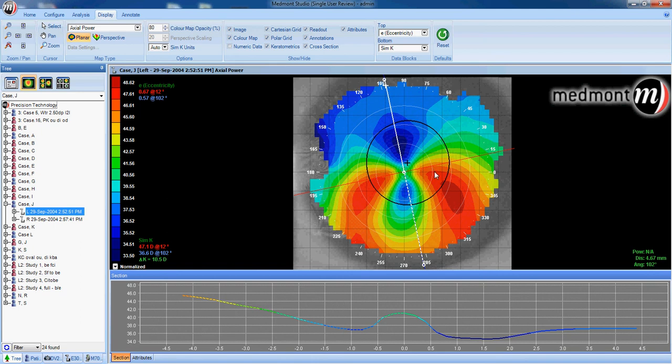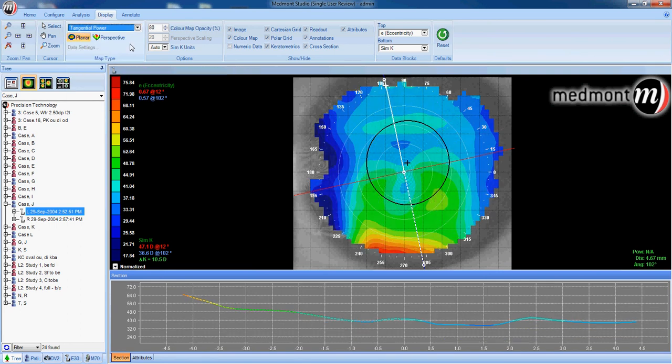And although there's a defined steep and a defined flat meridian, this pupillary zone looks slightly asymmetrical on this pellucid marginal degeneration patient. If we were curious where the steepest point of curvature is, we could select our tangential map and see that the point of most radical steepening is inferior. The point of most radical curvature change toward the flatter side is this deep blue area.